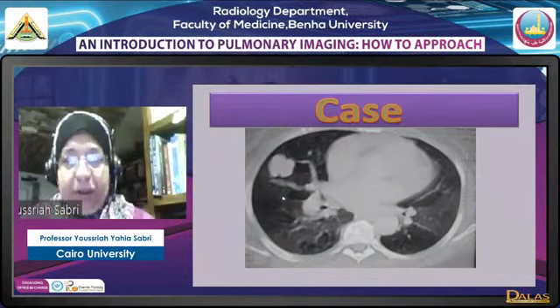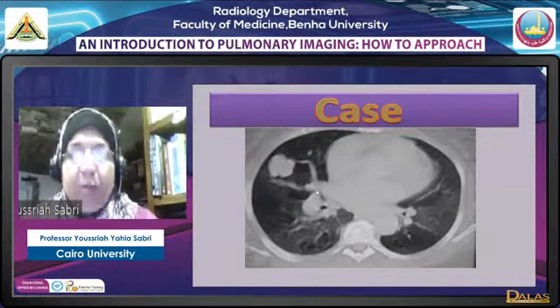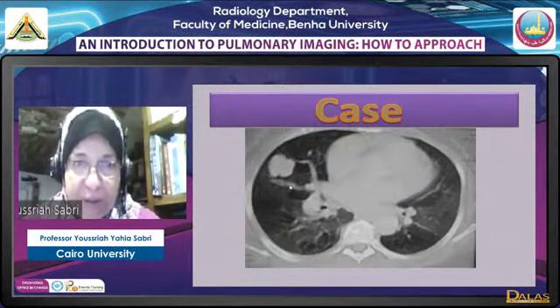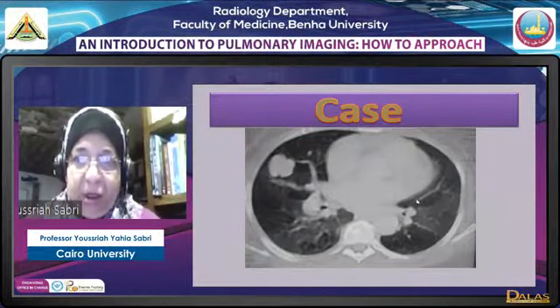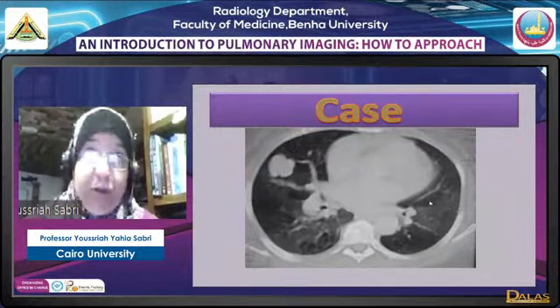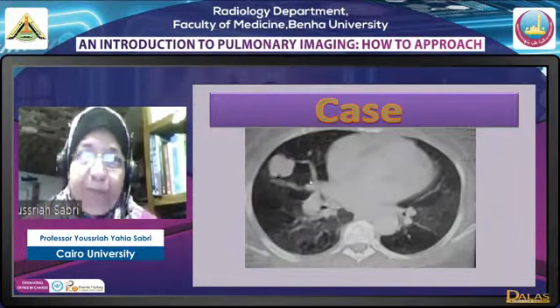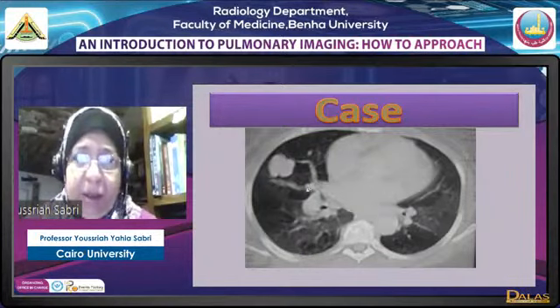We have a peripheral lesion with a lobulated outline, with vessels supplying this lesion. The most important thing about this lesion is that the vessels supplying it are very prominent. How do we know these vessels are prominent and we don't have a measurement? We compare to the other side. This is the normal caliber of the vessel in this region. This is the importance of comparison of sides. These are very prominent vessels going to it. So when we have a peripheral lesion with lobulation or smooth outline, whether nodular or mass, with markedly prominent vessels supplying it, this is an AVM.